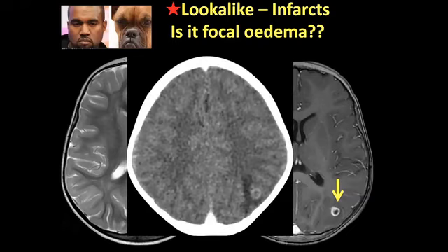And interestingly enough, this is what the patient looked like when they came back post-treatment. So the lesion was now dying. We had more edema, but we were now more easily able to see the classic peripherally enhancing lesion with the central dots.